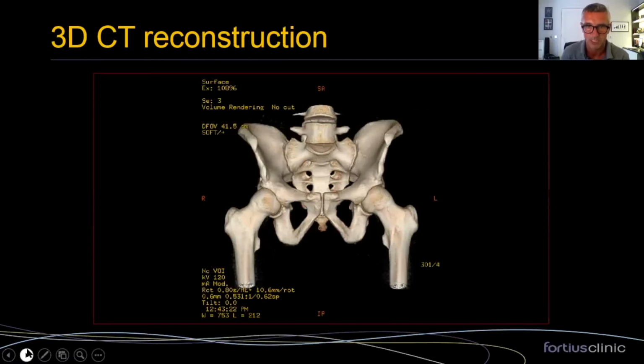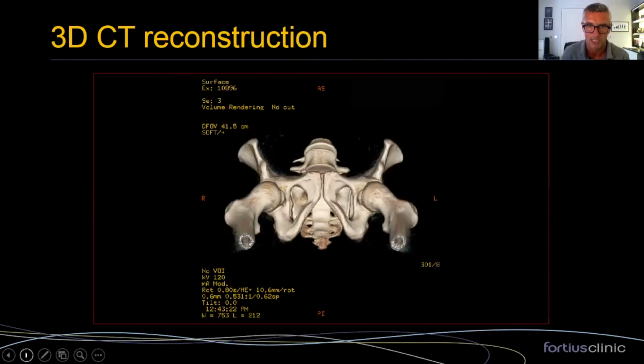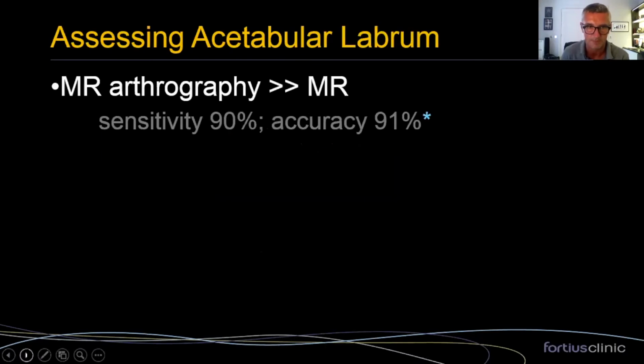This is it on CT. I mean, this is a bilateral cam lesion on CT. I'm not saying that this is the way that one would diagnose it, but often for clinical graphics, which is a computer-aided design motion analysis technique, you will see these sort of images.